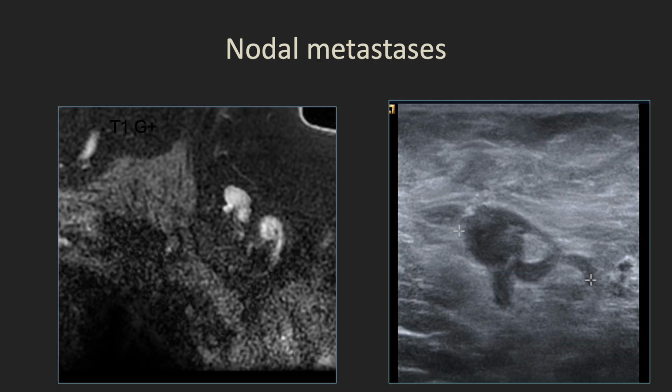And one more example here. This one, both have focal cortical bumps on them, and you can see those bumps prominently on the ultrasound. And obviously that is the bit that you want to biopsy if you're going to biopsy, not the normal nodal tissue back here.